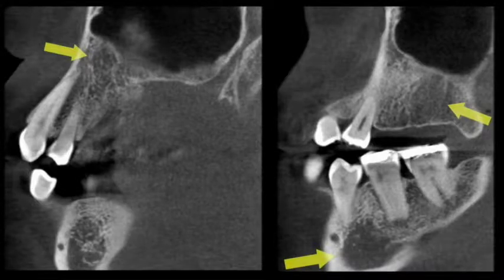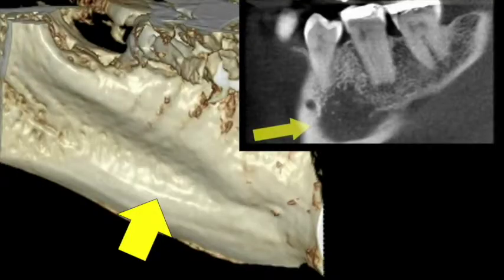We go further forward. You look up here. And then what about this? I saw one in the posterior part of the mandible this morning look just like that. Well, oops, that's just the submandibular salivary gland fossa. So unless you've got all the data, if you've got cone beam and you're not using 3D color surface rendering and you're not learning how to use the tools in your toolbox with your machine, then you're shortchanging your patient.